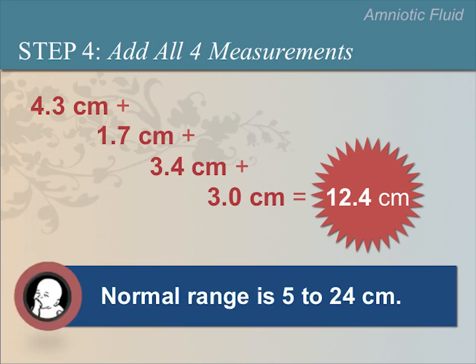Here are several examples of incorrect caliper placements to measure the size of the amniotic fluid pockets. Please pause the video now to ask participants why these caliper placements are incorrect. There are several reasons why they are incorrect.